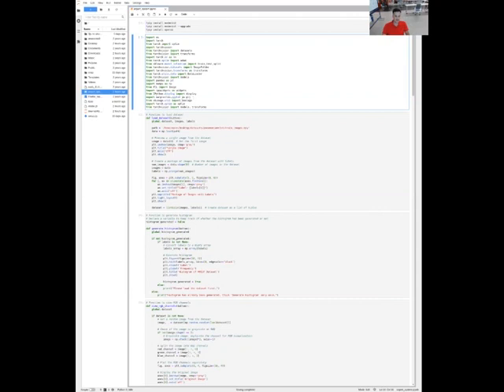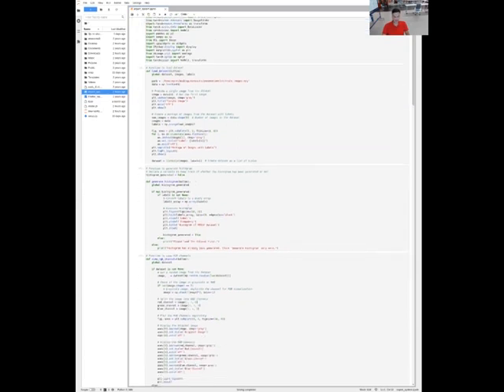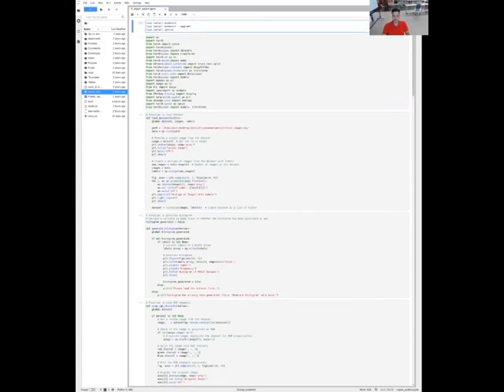The code is written in Python and utilizes various libraries and frameworks such as PyTorch, scikit-learn, and Matplotlib. The code is divided into sections, each representing a specific functionality or task related to pneumonia detection. These are all the dependencies, all the requirements for this particular project to process the images and train the model. And we can see here, this is a function to load the dataset.